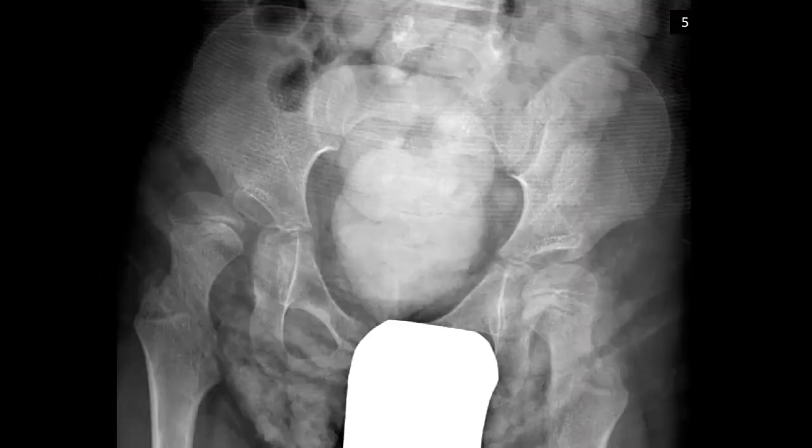Okay, this is going to be our final example where there is a live video. And then after this, I'll just show you the X-ray and then the answer. So go ahead, pause it, and do your measurement. I'll give you a hint. This patient does appear to have a Gothic arch appearance to the acetabulum.